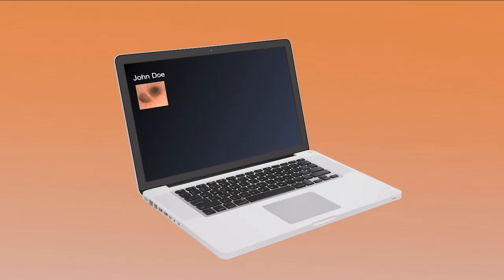That's it. You've now configured and used the DICOM function on Screeni from setup to export.